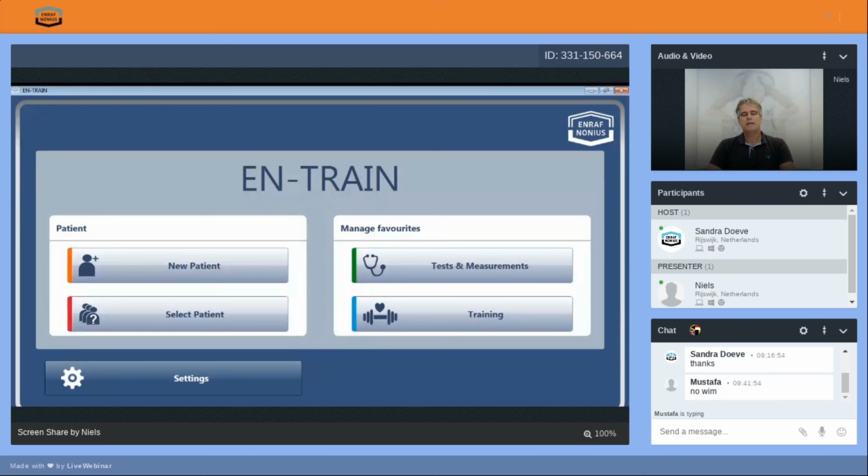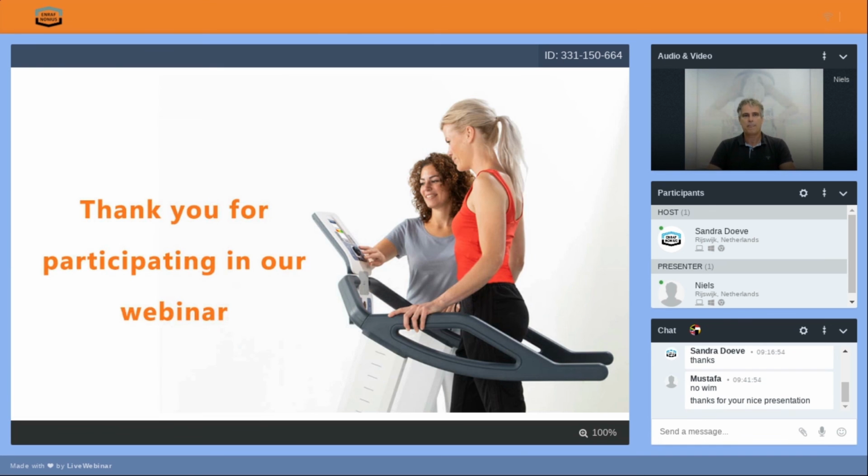And like always, if you have questions or there are problems or whatever you want to know, never hesitate to ask. We're here to answer all questions. But like with every software program, it doesn't matter if you have Photoshop or Entrain, you really learn it and you get really quick with it if you work with it. Just spend an afternoon by yourself, creating the cards, do a test, store the test, make a training protocol, and you'll be surprised how fast it can go.